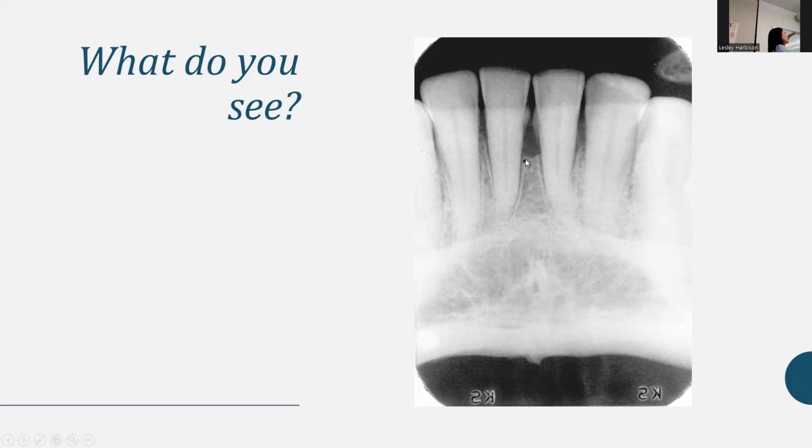Think of one slope either going higher on one side and lower on the other. If it just dips a little in the center of the bone, that's still roughly horizontal. But if it's tall on 11 and way down here on 12, then that's vertical. Okay.